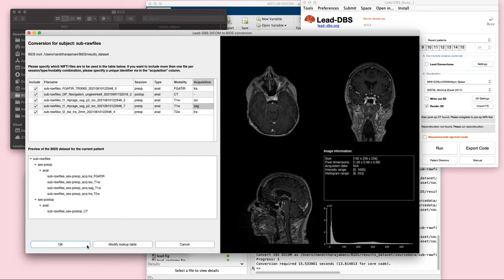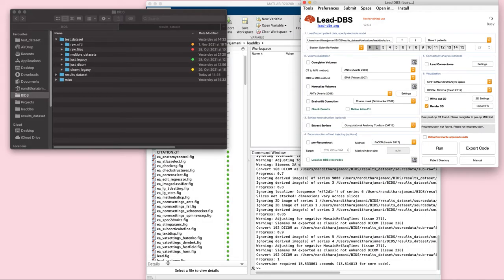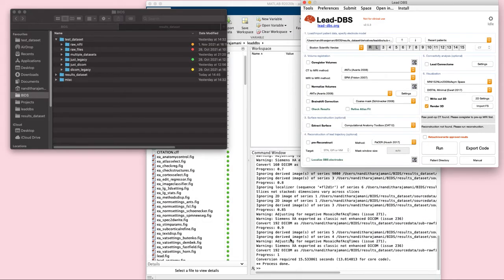We click on OK, we're happy with the changes, and as was before, the newly imported subject file is directly loaded to Lead-DBS, and the messages are also very similar messages.